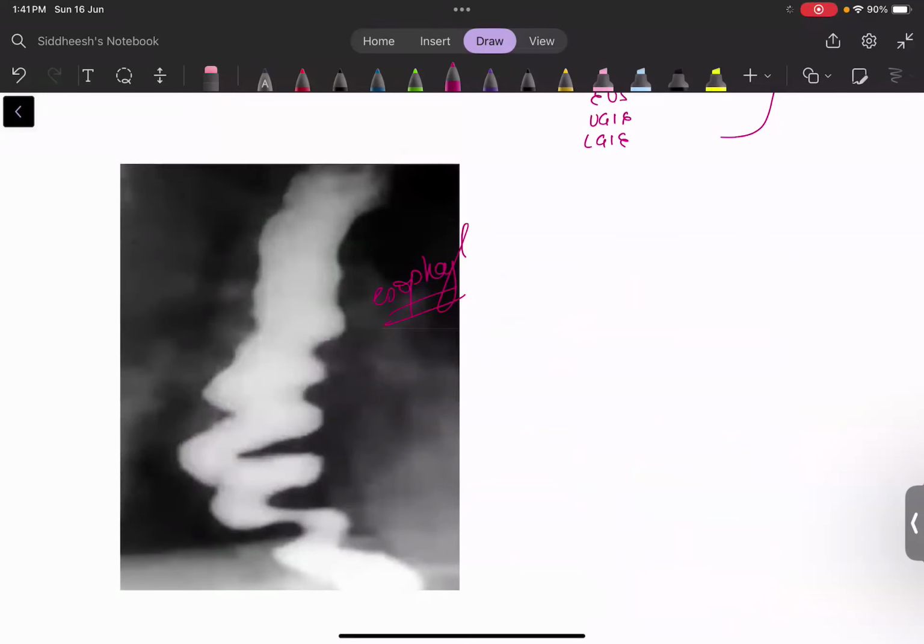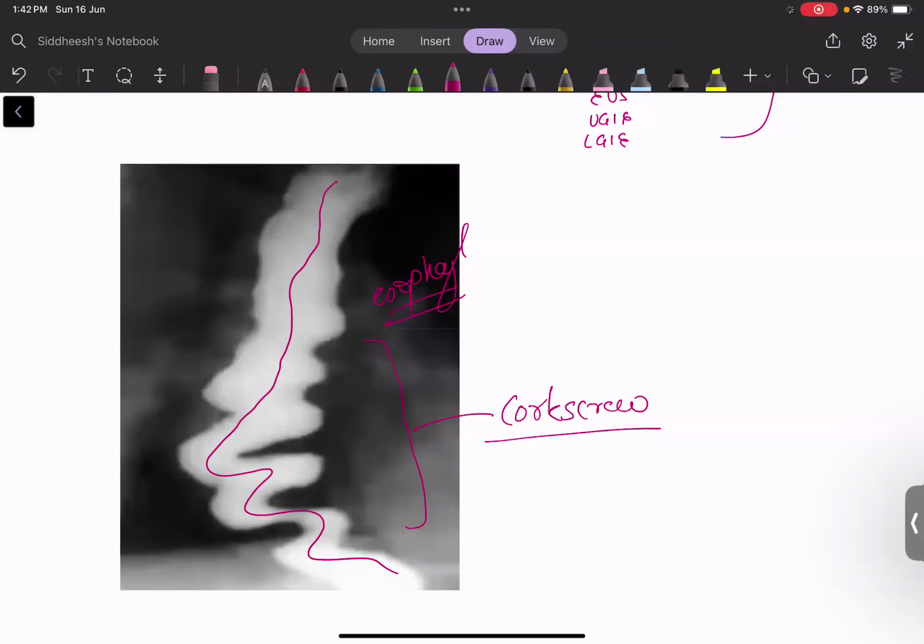But the problem with the signs is what? They can mimic other signs also. Now, technically, this image, as per the textbooks, some report as a corkscrew. But if you have ever seen Google images of river bodies, you might find a river flow like this. Are you all agreeing with the same part? It is moving like this only, correct? So this can be a river flow sign also, this can be a corkscrew sign also.